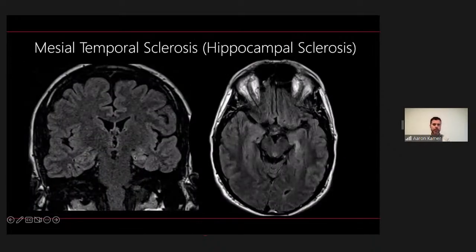And here's that hippocampus. Here you can see it on the axial images. Sometimes they show up nicely on axials. Sometimes we only have good axials. So make sure, especially in a seizure patient, you're also paying attention to the hippocampus on the axial views, even in patients who have a good coronal, because you do want to train your eye to find where the hippocampus is located on an axial study in addition to the coronals, because that can be a little bit harder to get used to.